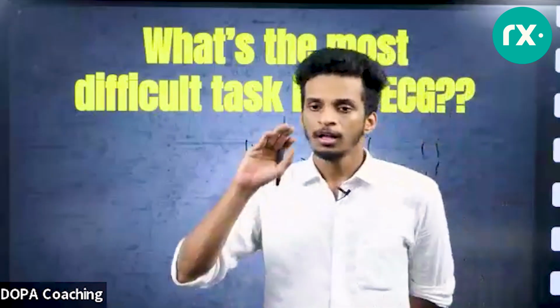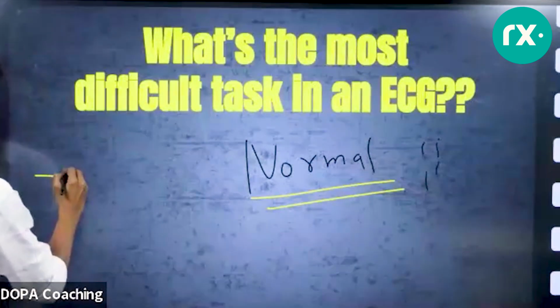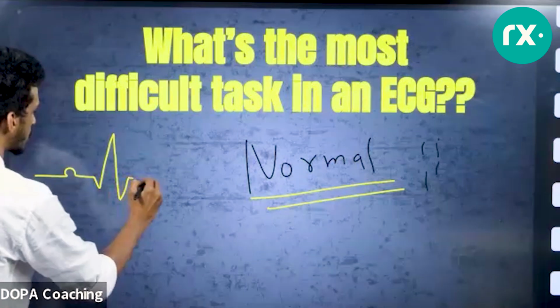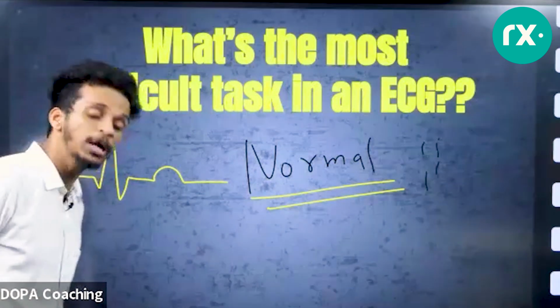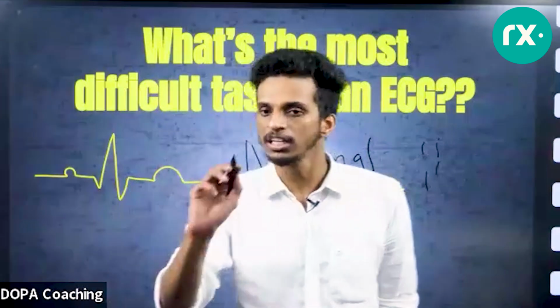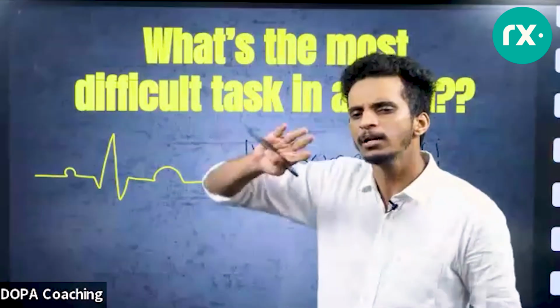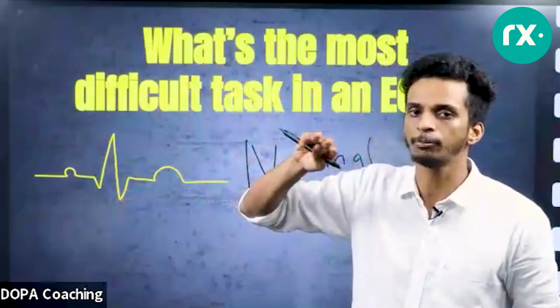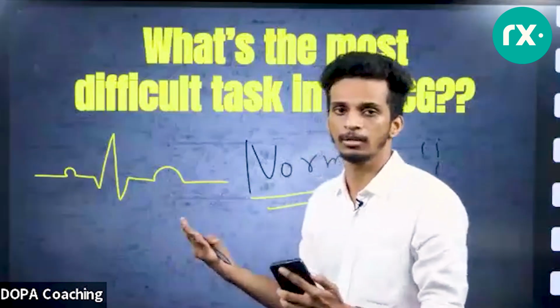So we know a classical ECG looks like this. We have studied it from 12th class. This is the P wave, this is the Q wave, this is the R wave, this is the S wave, and this will be the T wave. So this is how a classical ECG looks. But in real life, you won't see classic waves like this. It will be a little bit of what we expect, but not up to our expectations. There will be some variations from the classical ECG findings.